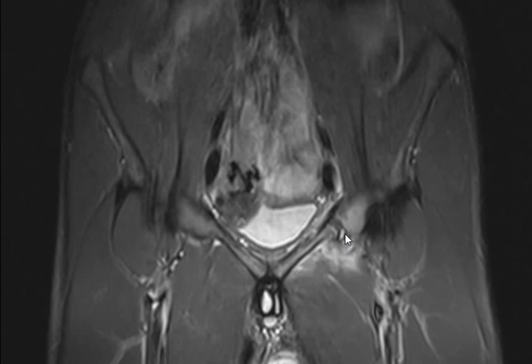Can we consider this line as a fracture, a pathological fracture? So now you consider it a pathological fracture. Why pathological fracture? What do you mean by pathological? There is an aggressive lesion within the bone. Causes, like what? Maybe secondary metastasis. Metastasis. Nice.